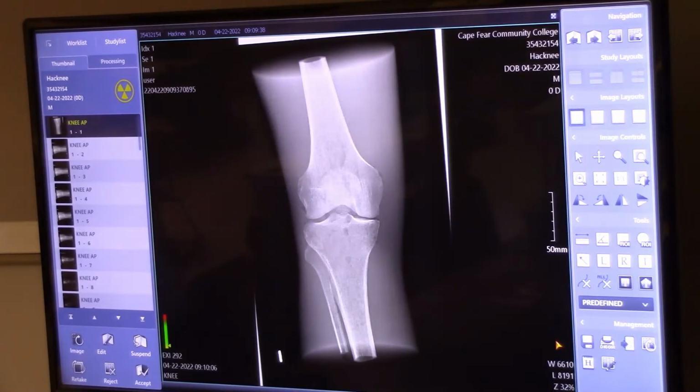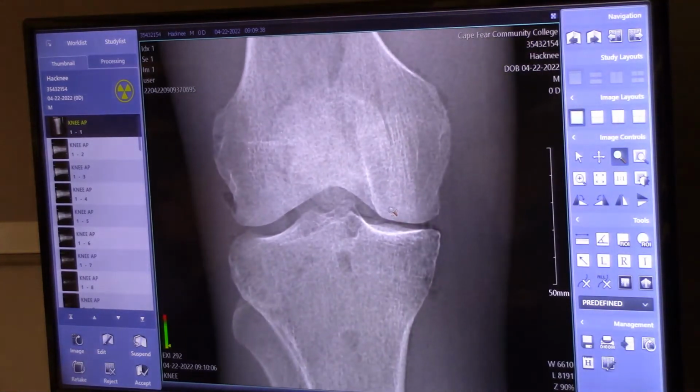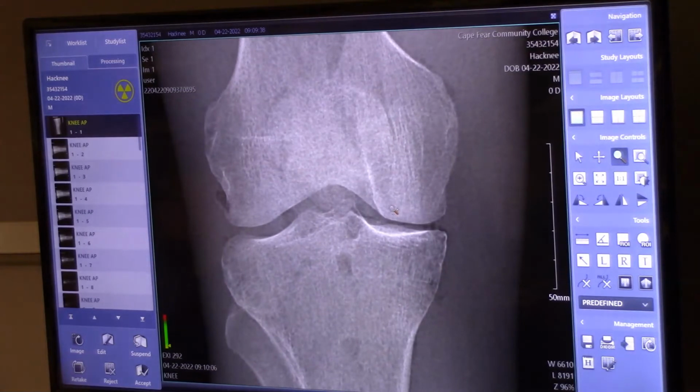I think so. Okay, so this was with our DR system, and this first exposure we took was like 1 mAs. Is that true? Okay, 1 mAs. Did we get an image? Is that a usable image? Is it mottling? A little bit.